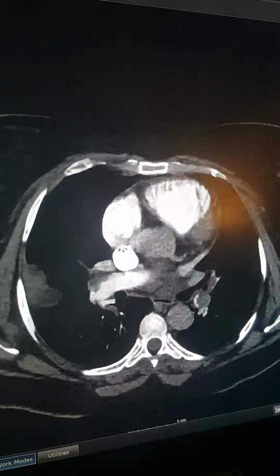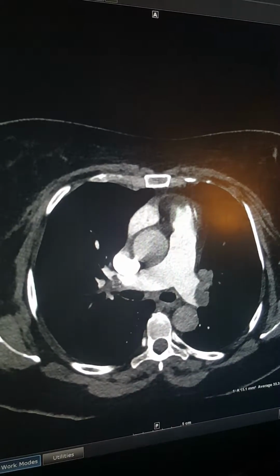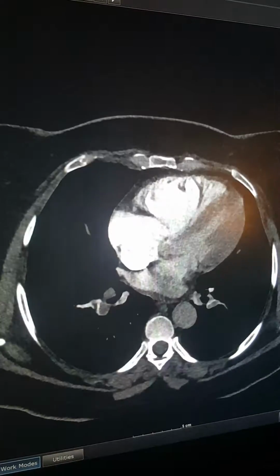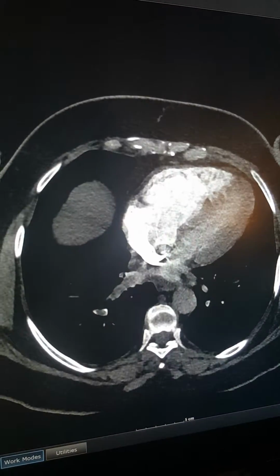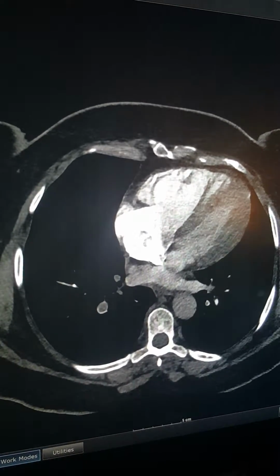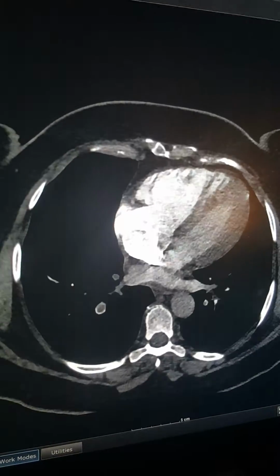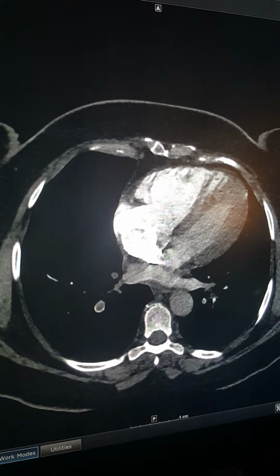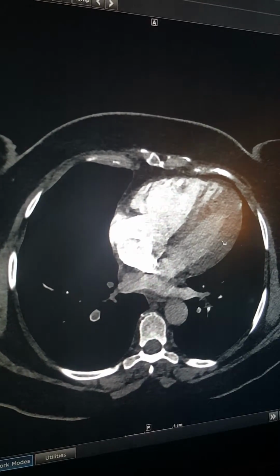So here we can see that the pulmonary artery is slightly dilated; we measure it as 30. What's the normal size? It's 28 on average, but actually there are multiple articles talking about distribution regarding age and sex, but people use 28 as a cut point. But the thing is the discrepancy between the right ventricle and the left ventricle chamber.